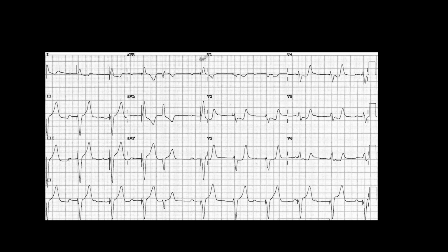That's not what we want. The ST segment should be going with the T wave or should be isoelectric. And since I have ST depression in the presence of a downward QRS in a wide V-paced rhythm, that is going to be Sgarbossa B criteria. This is the actual STEMI equivalent. Can't call it a STEMI because there isn't ST elevation, but it is a coronary occlusion requiring PCI.